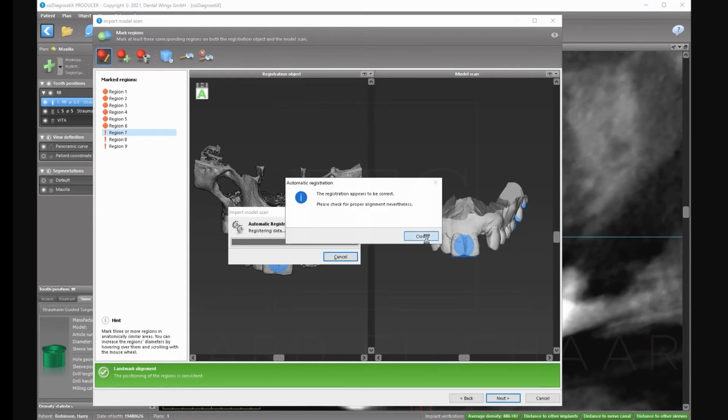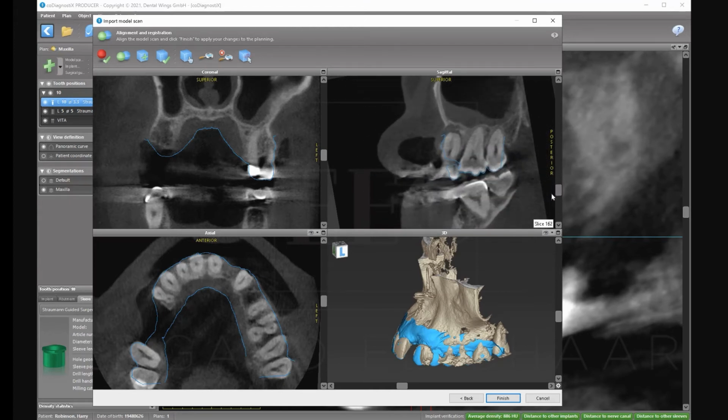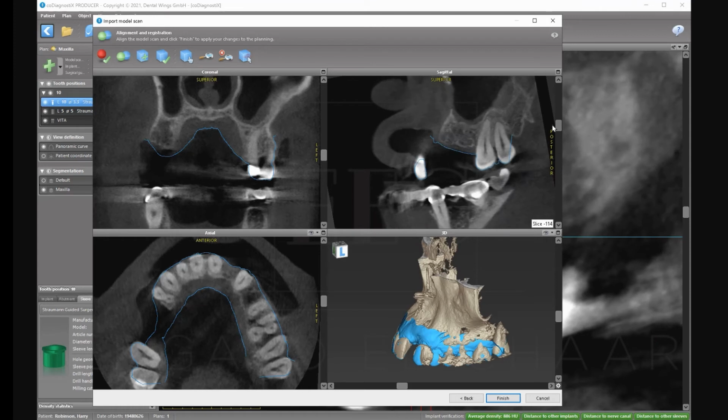It looks correct, but I don't care. I like to verify it. You need to see how it's seated, how the tooth is seated on it. So you turn it around and around. Don't forget that, see, that's not bad. It looks okay, and it looks pretty good.